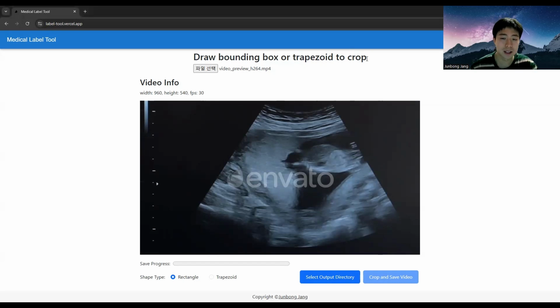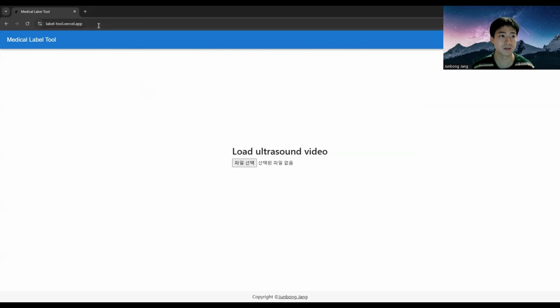Hello, my name is Junbong Jang, and in this video, I'll present how to use the medical label tool for cropping ultrasound videos. So first, if you refresh this website, you'll see this. If you open up this link, you will see this page.